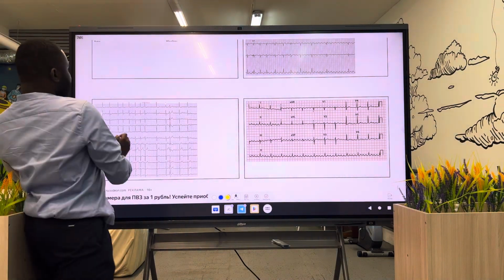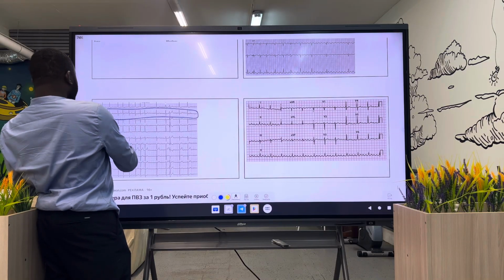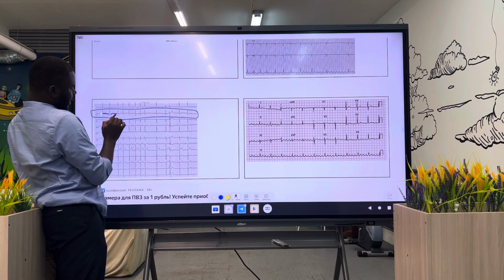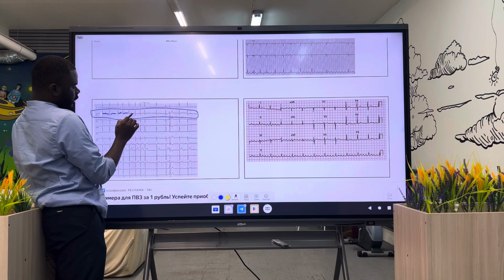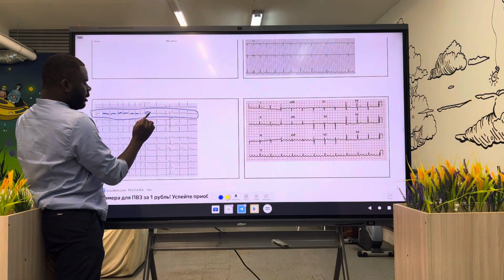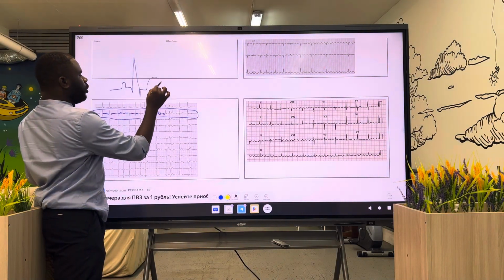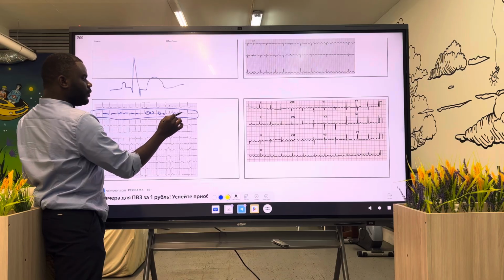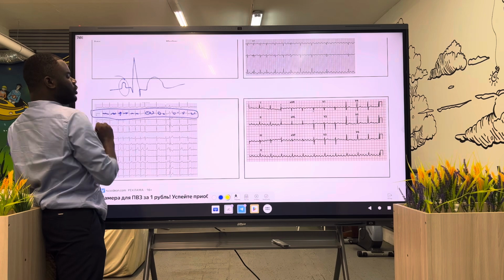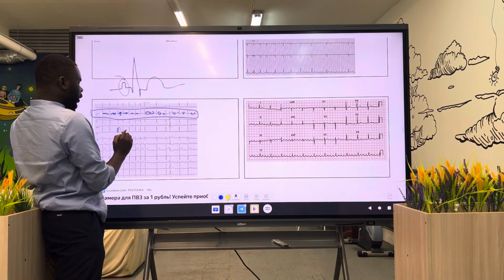So this is a very good ECG from a patient. If you look at it very well, we'll pick up lead 2, right? So if you watch very well, lead 2 is a bit shaky. You might say, oh, sir, but maybe this is P wave. If it is there, it is there, you know. But these are red flags all over the place. So P wave is usually stable and constant. So we obviously know that this is not P wave. So it is non-sinus.